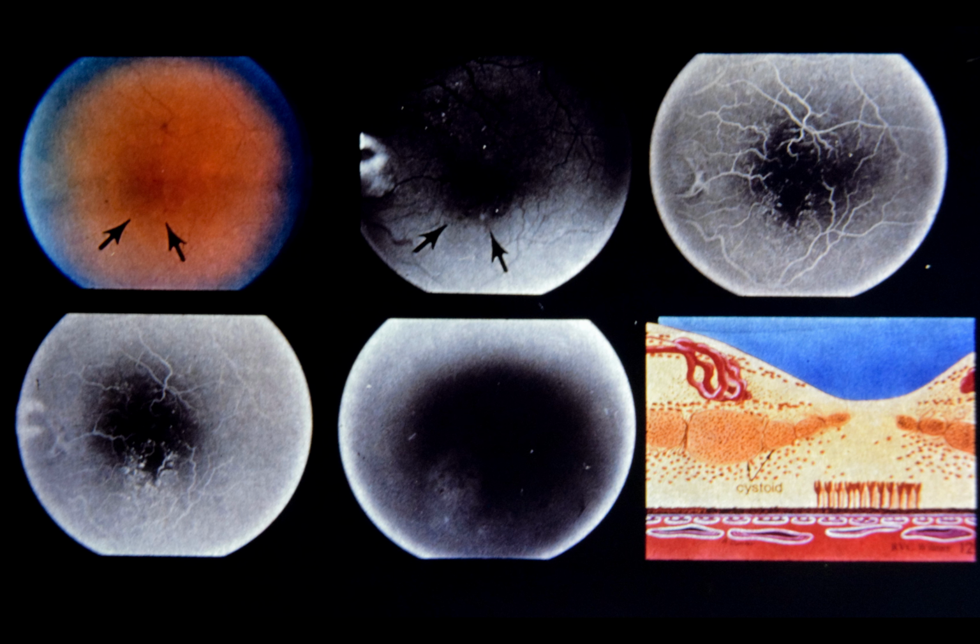Scattered hemorrhages and microaneurysms are seen inferonasal to fovea. Upper center, photograph of same area taken in red-free light. Upper right, 20 seconds after dye injection, note retinal non-perfusion and adjacent capillary dilatation. Lower left, 25 seconds after injection, note early leakage from dilated capillaries adjacent to area of non-perfusion. Lower center, 30 minutes after dye injection, note well-developed cystoid maculopathy, which explains visual acuity of 20/70.